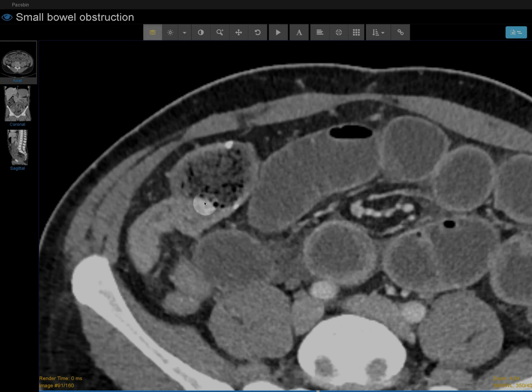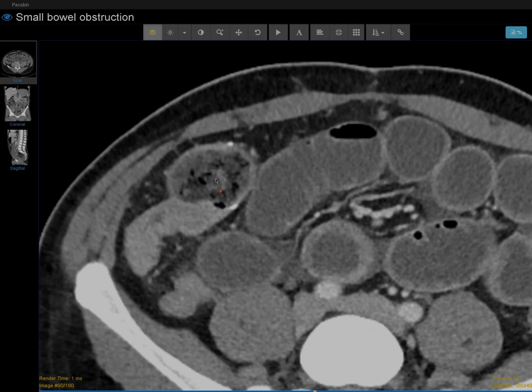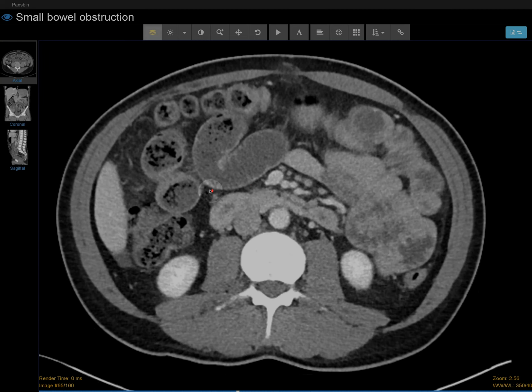So I'm guessing that this person probably had a small bowel resection with a reanastomosis, and there's obstruction at the site of anastomosis. That's my diagnosis. Now, the other thing that I do want to find out is if there is bowel ischemia.